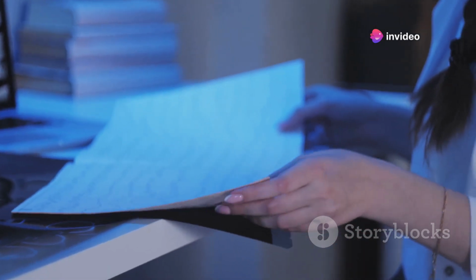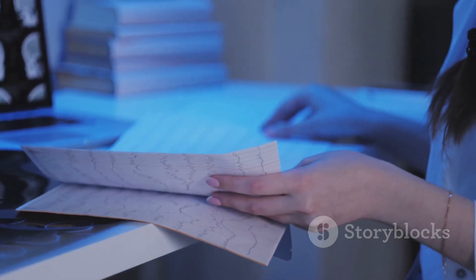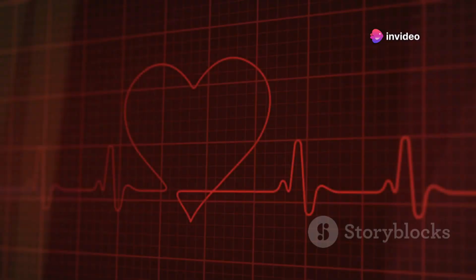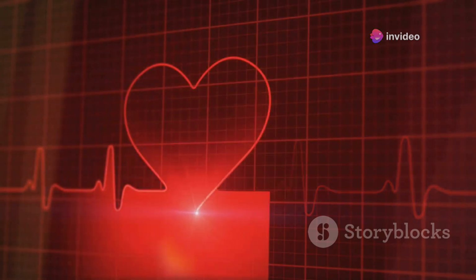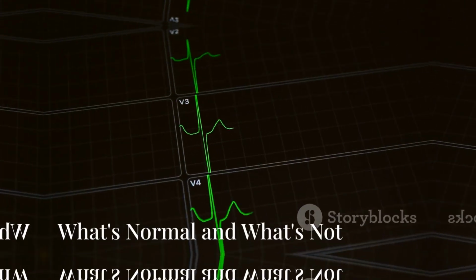Following the P wave is the PR segment, which reflects the brief pause at the AV node as the electrical signal is conducted from the atria to the ventricles. The QRS complex follows the PR segment and represents the depolarization of the ventricles. The T wave follows, signifying the repolarization of the ventricles as they relax. Understanding the meaning of each wave and segment on the ECG is crucial for accurate interpretation.